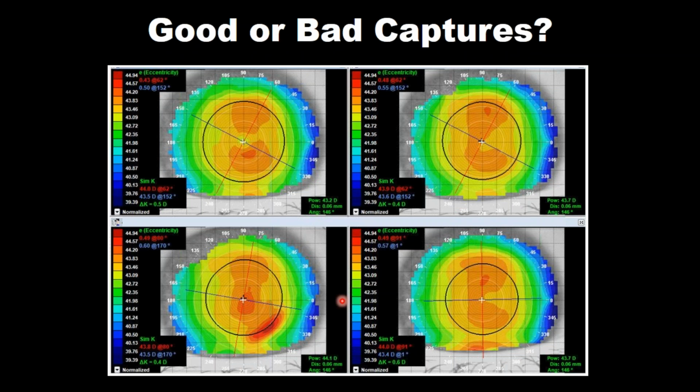How about here? Do you see 4 topographies that look reproducible? Could you trust building your contact lens based on the shape of these eyes? And map number 1 shows what John Mountford would describe as a divot in the center, a hole in the center of the topography. We're seeing in number 2 this peninsula kind of cutting out the center of the topography. So is that the beginnings of a tear film breakup? Number 3, we have a high point here, another high point here. We've got a 90-degree angle in here. There's all these sort of angular points in the surface indicating the tear film wasn't really all that smooth.